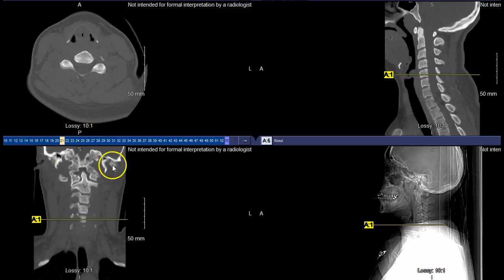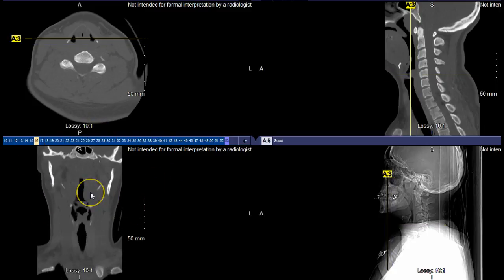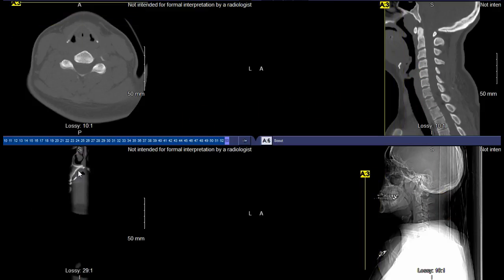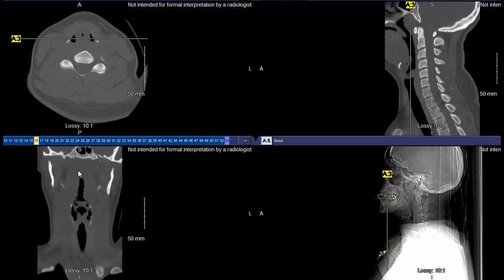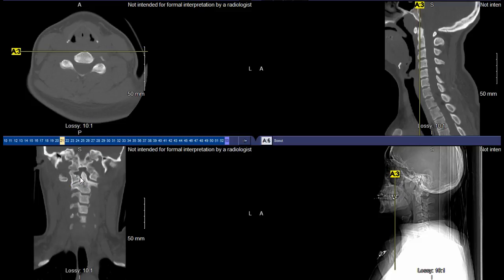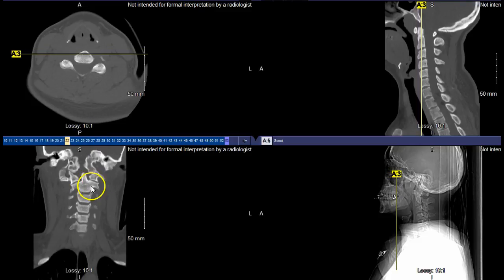So to look at it and emphasize some other orientations, we can see the coronal orientation. And throughout this, hopefully you're utilizing the guide to help you set these images so you can see where you're at respectively. But as we go from front to back, and we know that the spine is posterior, you can start to see it actually coming into range right in there. Respectively, we can tell very, very clearly where we're at.